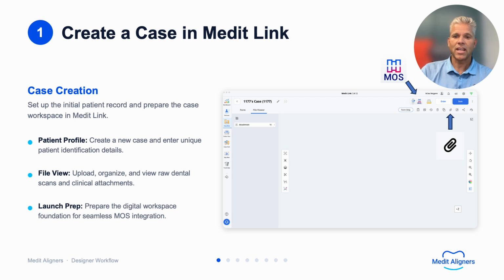If you're importing a scan from another scanner, create a new patient case and use the paperclip icon to upload the scan and attach it to your case. Also use the paperclip icon to upload all patient photos and radiographs before clicking the MOS icon to launch Medit Ortho Suite.